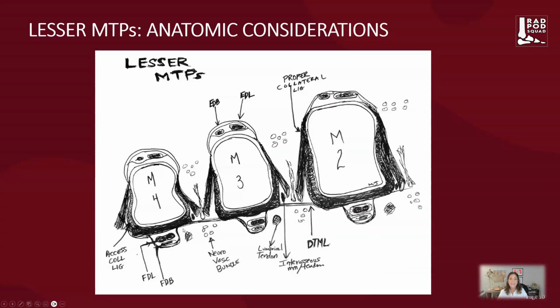Looking at the metatarsal heads in transverse, we can begin to appreciate we have the plantar plate, we have the accessory collateral ligament, and where that joins the deep transverse metatarsal ligament, we have that reinforcement. Of course, the proper and accessory collateral ligament really can't be dissected from one another in the course of reading an MRI if they're normal, because both are low signal and do not contain water. In between the articulations of, say, M2, metatarsal 2, and metatarsal 3, we have the metatarsal bursa, and that's a potential space that can become inflamed and enlarged during times where we have rotational or increased stressors at the metatarsal head.